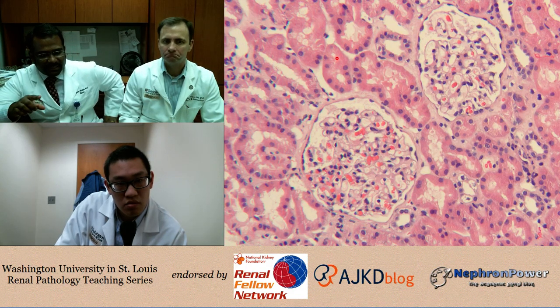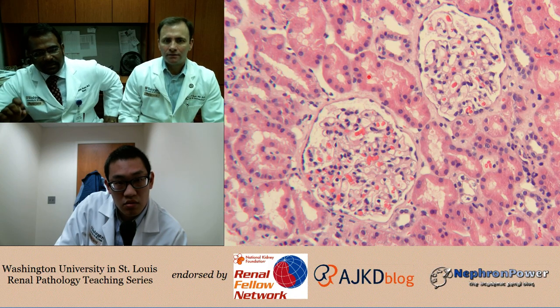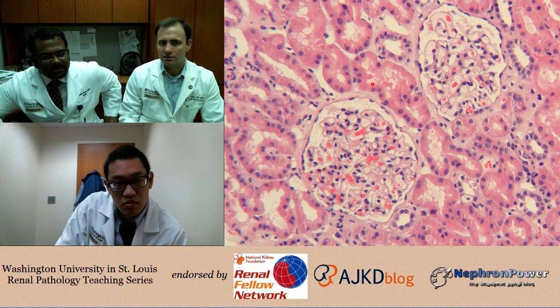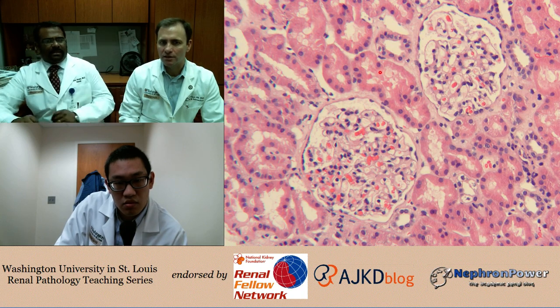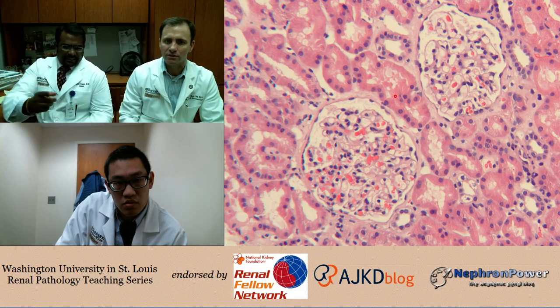There's not too much debris. I see the proximal tubule brush borders here and there. Well, it's hard to appreciate the brush border just on the H&E. It's very high power, you can appreciate it. However, it's best seen on that PAS stain, where you have that thin sort of pink line highlighting the brush border.